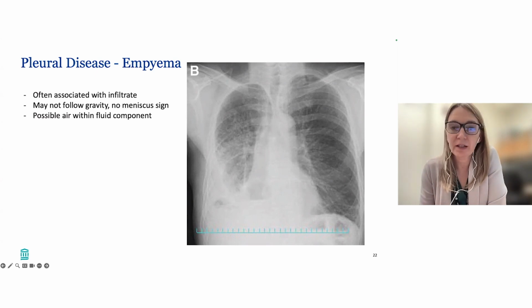There may also be air within the fluid component of an empyema, indicating gas-forming bacteria or bronchopleural fistula. And if you look here, you can see some air within this empyema. An empyema should always be drained, as antibiotics alone are unlikely to resolve this infection.